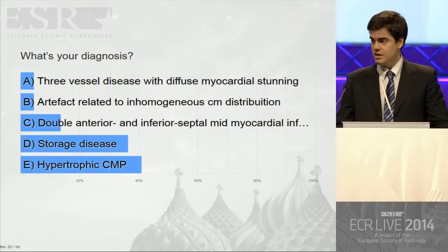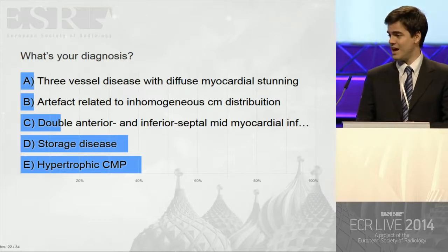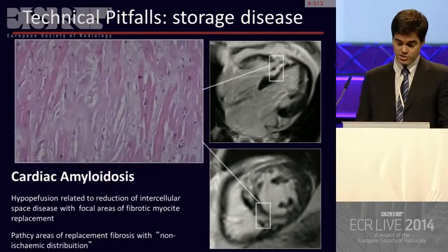Okay. There is a fight between hypertrophic cardiomyopathy and storage disease. This was effectively, and I'll show you, a storage disease, a cardiac amyloidosis.